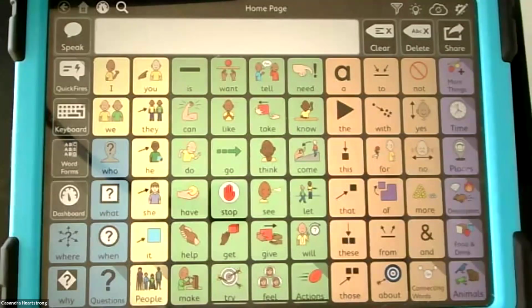It's in yellow, just like on TouchChat WordPower. Do you notice where on the screen, right, left, middle, the pronouns are? They're on that left side, just like TouchChat WordPower. What color are the verbs, the action words? They're in green too. They're also in the middle because that's where they go in a sentence. So again, just made for language and literacy development.